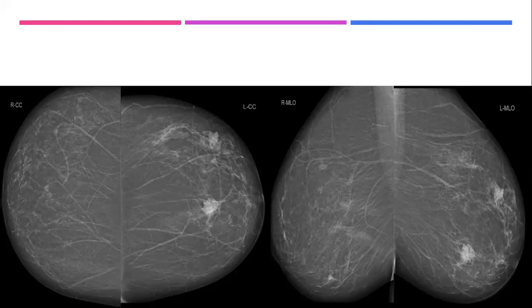How could we characterize these lesions, to classify it as BIRADS? Quickly, BIRADS? BIRADS 4C for me. Excellent, BIRADS 4C. Why BIRADS 4C? I need one word. Tell me why BIRADS 4C, because of? Spiculations. If it is spiculated, it will be 5. But we are not sure if there is spiculation or not. But we are sure these are irregular in shape. Indistinct.